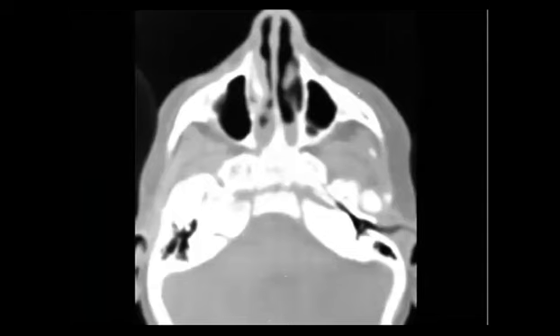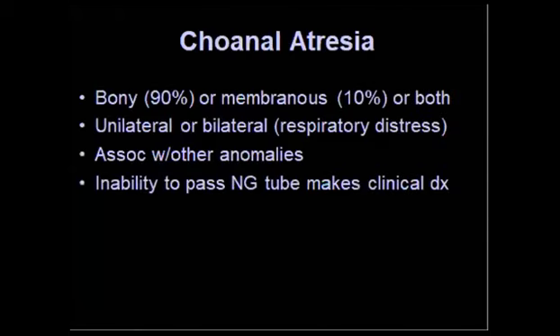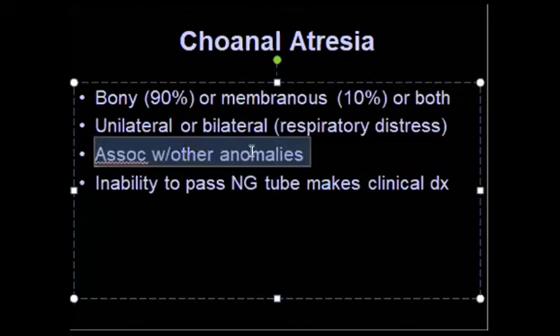Sometimes they like to show you this, and this patient has a problem like respiratory distress syndrome. Sorry, this is choanal atresia. Respiratory distress, and he has closure of the choana, the posterior nares. So this is what's called choanal atresia. It can be bilateral, then he has much respiratory distress. Then search for other anomalies.